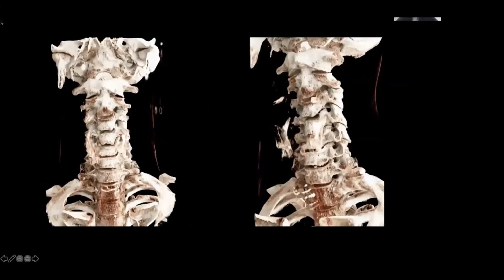Moving on to, and I see we have about 10 minutes left, so I'm going to go through the rest relatively quickly. Again, an anterior projection and an oblique anterolateral projection. I really wanted to give you guys a sense of what the neural foramina look like, where the nerve roots are going to come out.